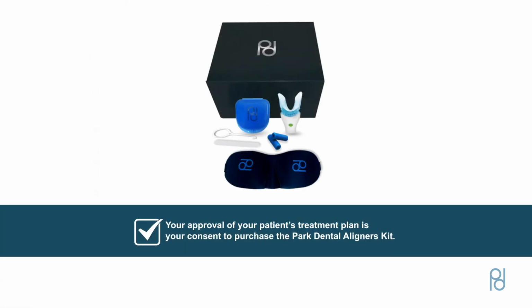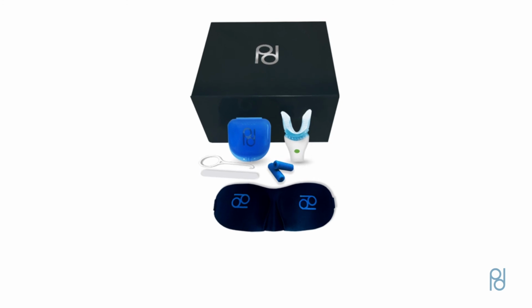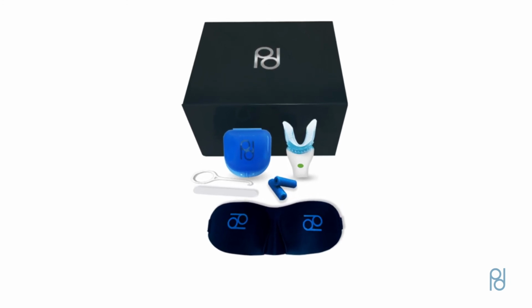Your approval of your patient's treatment plan is your consent to purchase the Park Dental Aligners kit. If you do not have payment information on file, a Park Dental customer representative will call to help set up your account and payment preferences. Once you approve the treatment plan, we will be notified and begin the manufacturing process for your patient's aligners.